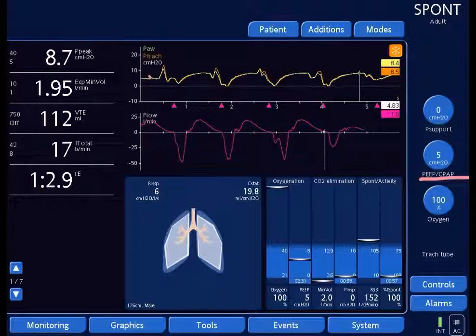During breath termination, the pressure in the exhalation valve is briefly dropped below the set PEEP. We have a set PEEP of 5, but as you notice, it's dropping all the way to 0 here. But it never goes negative, so it doesn't create a negative pressure. This decreases expiratory resistance. Now, there are skeptics who are concerned that with pressure dropping below PEEP, there's a potential for lung de-recruitment. However, the period is so brief that it's not enough time for de-recruitment. Still, if this is a concern, there's an option to turn off the expiratory portion of automatic tube compensation, which I'll show you on the simulators to follow.